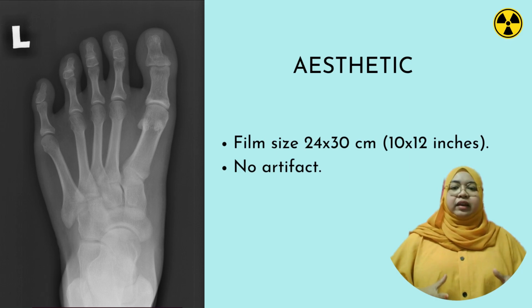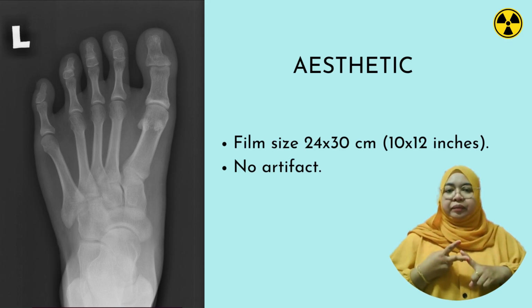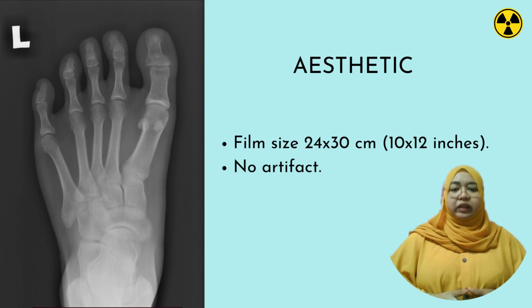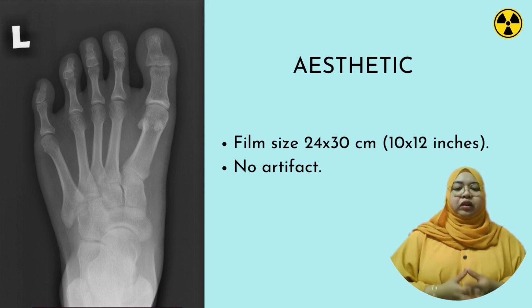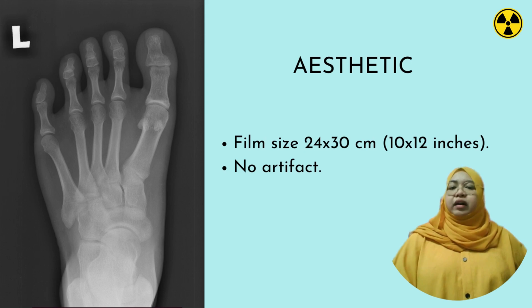Aesthetic refers to film size and also artifact. From this radiograph, we use the film size 24 x 30 cm and also 10 x 12 inches. That is sufficient to include all the region of interest. And from this radiograph, we can see there is no evidence of artifact.